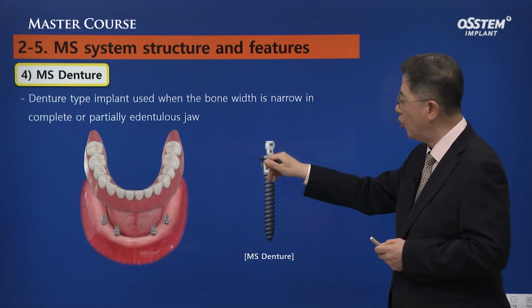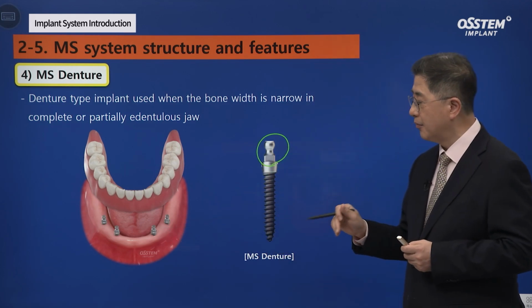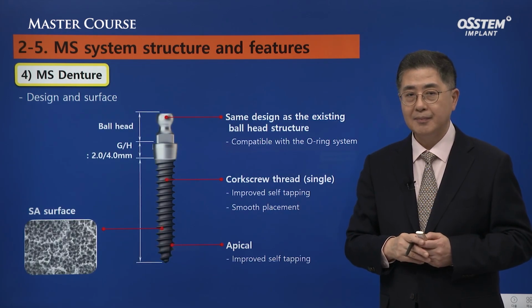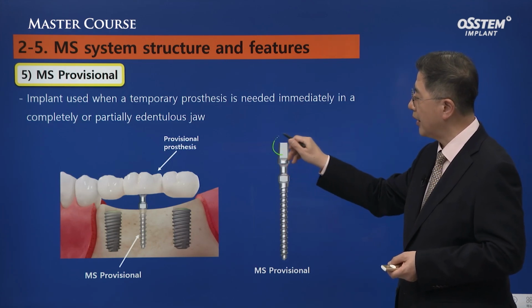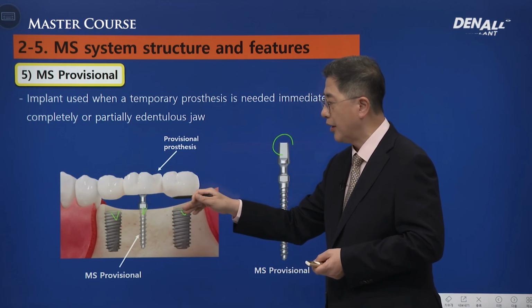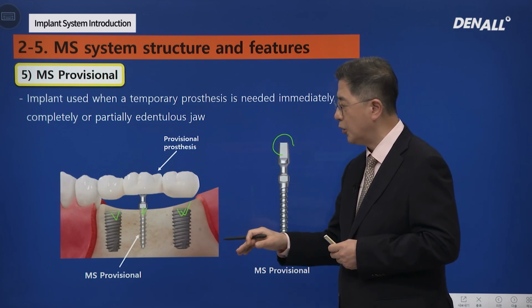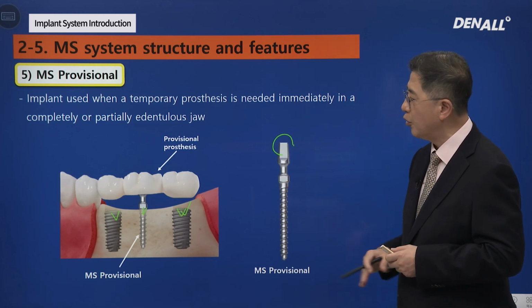As for denture type, this is a ball attachment for overdenture. But if there is wear and tear on the attachment after osseointegration, there can be issues, so we have to keep this in mind. And in the case of placement of multiple implants, you can use this provisional implant to help restore masticatory force while the osseointegration is underway. But as the osseointegration can be completed quite quickly, and with just 3 or 4 implants placed we can go ahead with the provisional prostheses right away, I rarely use it.